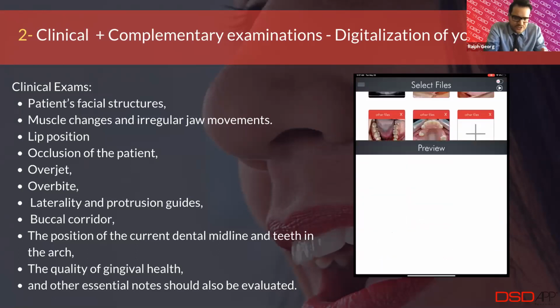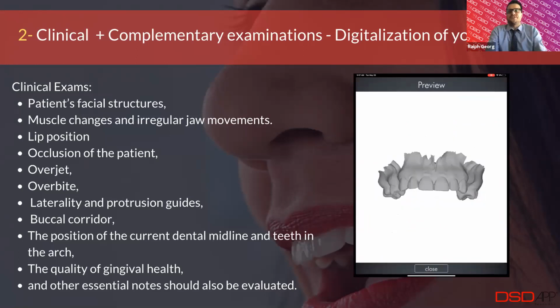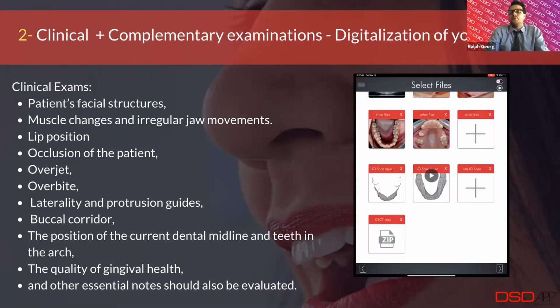Normally what doctors are doing, and I'm sure there are a lot of doctors in this room, is they have to go into Dropbox, look for the file, get it out of Dropbox, and then go to their server, log in, and pull up the images. With this, as Dr. Diogo explained, you can make this your point of reference, and these files will live in here.